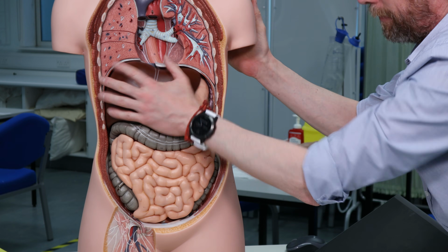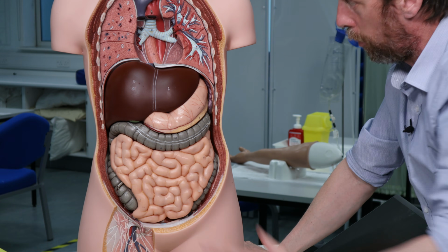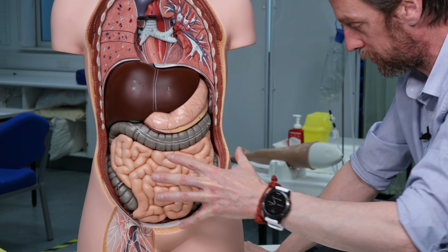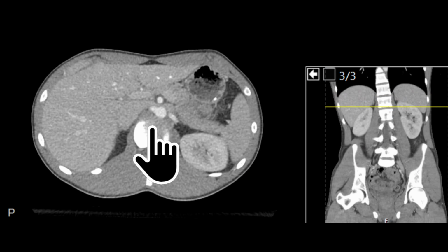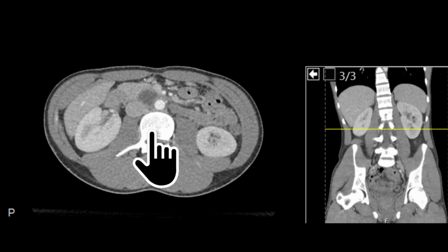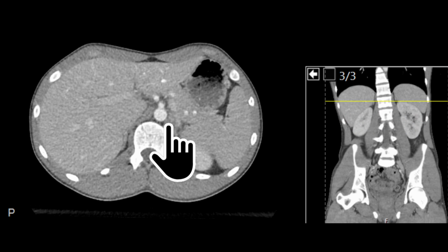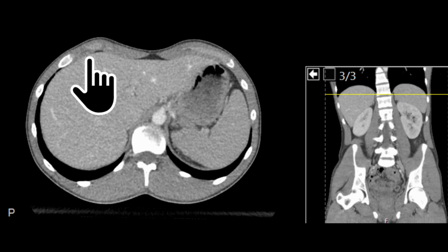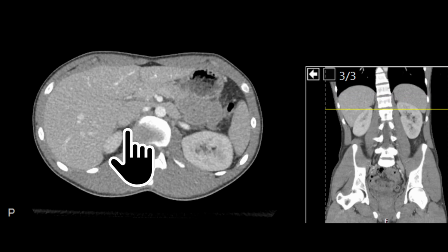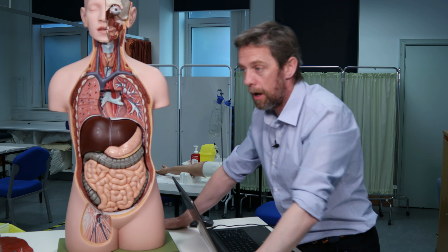So that is just trying to give you a 3D sense of where things are. That's what we were looking at, that three-dimensional stuff. It's a tricky thing to do. Looking at images a lot makes it easier. The abdomen is a lot more difficult to work out what's what than the thorax, I think. But do it yourself. Have a look at that scrollable image stack. They have other sections as well, other directions. See if you can work out what's what.